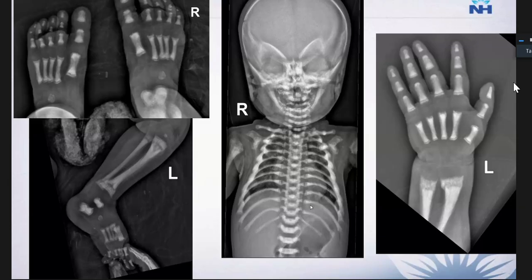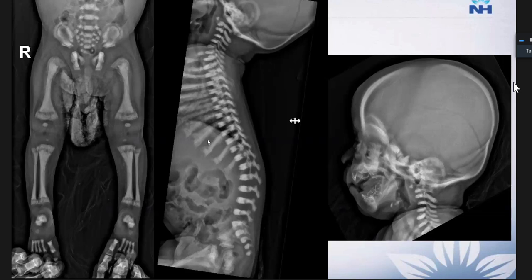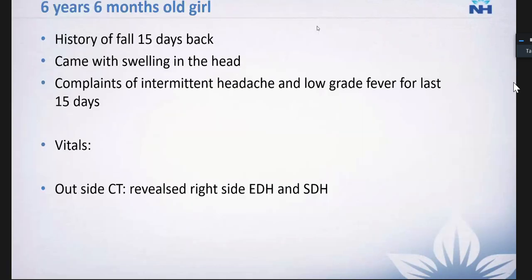You can see the skeletal survey of the thoracic rib cage, which shows diffuse sclerosis of the ribs. The long bones also show the medullary canal being replaced by sclerosis, and we are dealing with some sort of sclerosing dysplasia. These are the classical findings of osteopetrosis. So this was a case of osteopetrosis, which was subsequently proven on a genetic basis. Now, here is one more interesting case.